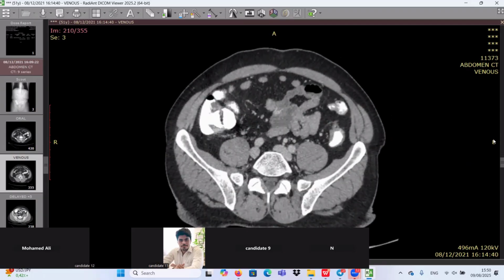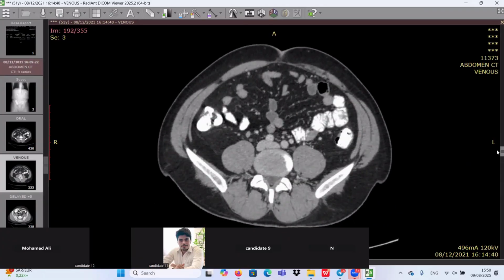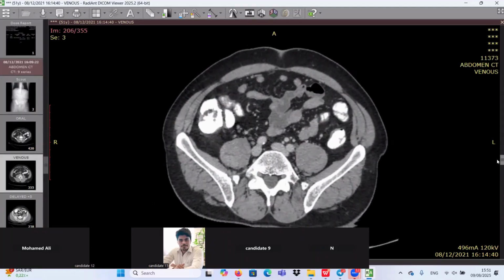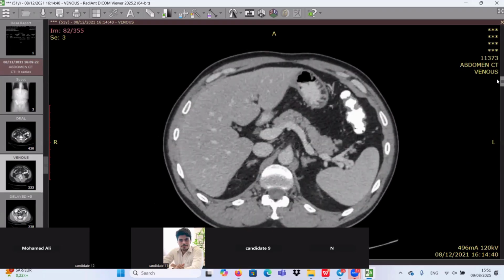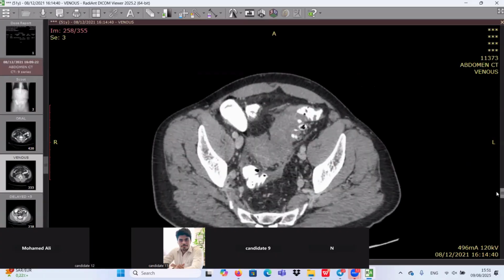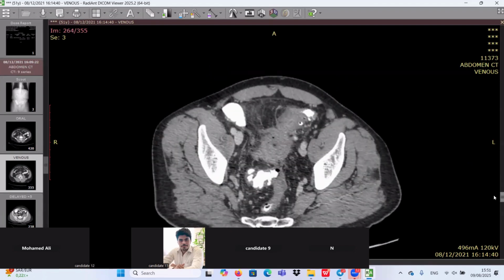Okay. Okay, perfect. Do you have any more negative findings that you should mention? Yes, I should exclude obstruction. Do we have any bowel obstruction? We don't have any. Actually, there was none. The colon is of normal diameter and the small bowel as well. Very nice. Okay. Any sign of fistula formation within the adjacent bowel? Do you have any fistula formation?